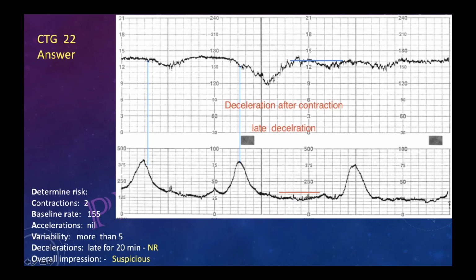You see, if you look at this deceleration, this will be 1 minute. Ma'am, starting here it is there, so 2 minutes, I think. It is 2 minutes only, from starting here to here. 1, 2, 3 minutes.